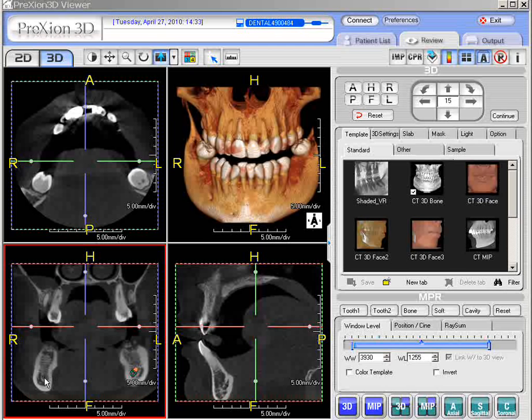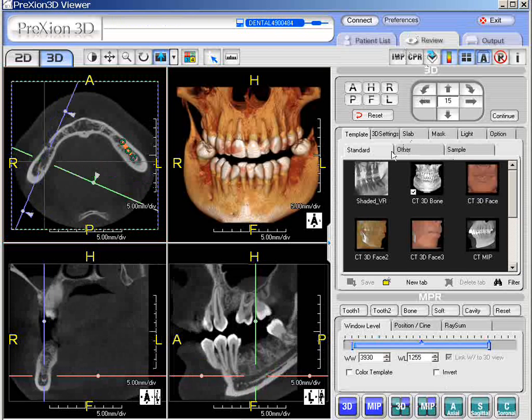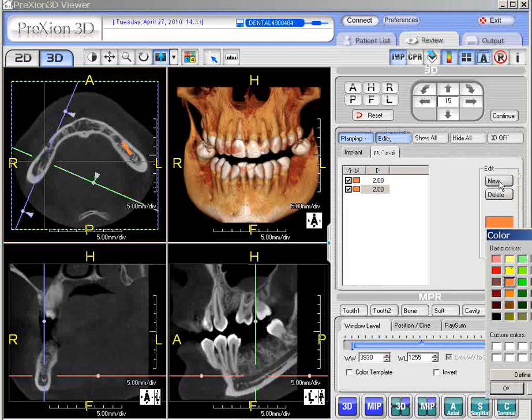For instance, here we have the mandibular canal. Once again, we're going to bring in our Alt key, and holding the Alt key down, we're going to click right in the circle, remove the Alt key, go up to the anchor point, go across to the blue line. Now here, this patient has a very nice mandibular canal. Some of them are a little more challenging, but this is pretty easy to see actually. Hit the implant, and we're going to go mandibular canal, go new, and now we can create one for the other side. By the way, we could change the color. Okay, you click a different color if you want. Let's make this one red.